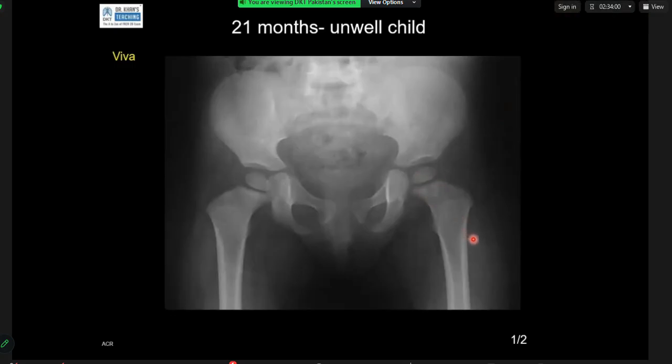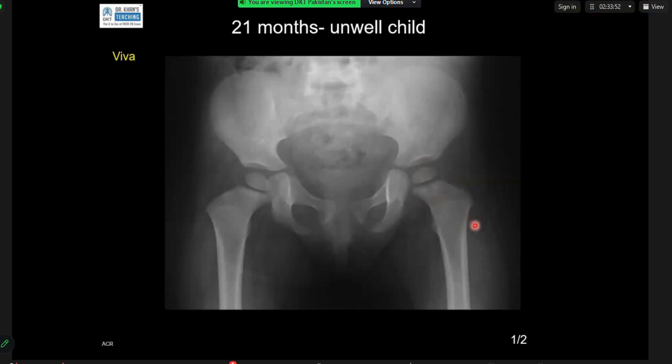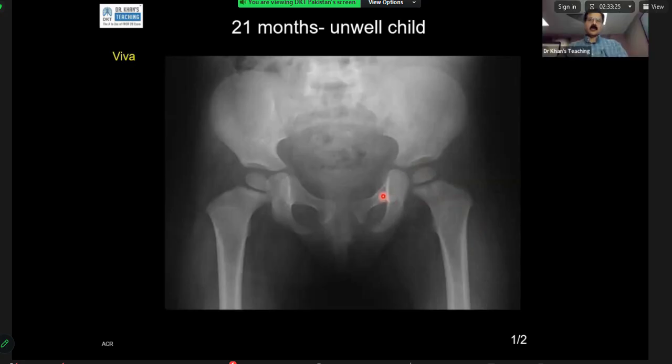It's around the femoral epiphysis. It is metaphysis. This is the epiphysis. So this is the metaphysis. Yes, please. In the region of the metaphysis, when compared to the other side, I do see a longitudinally shaped lucency, which extends to the proximal margin of the metaphysis. I do not see any fractures and no soft tissue component in that region. Okay, just 1 second. Is there a soft tissue component here where I am pointing out?